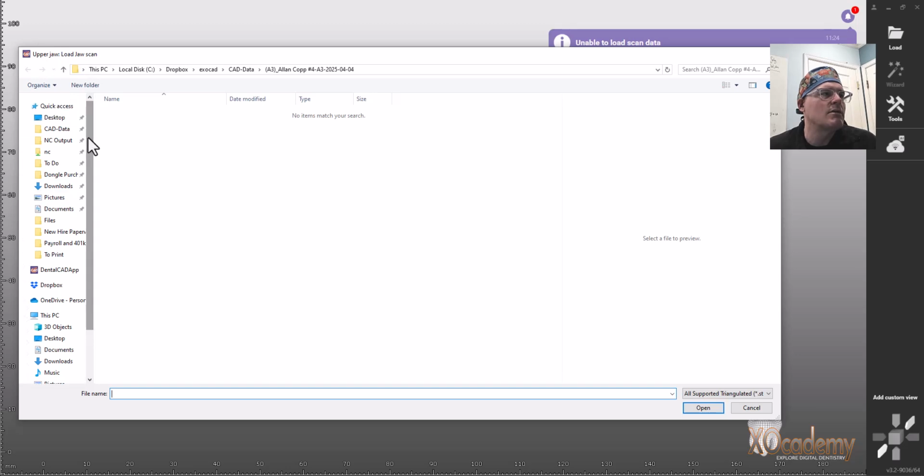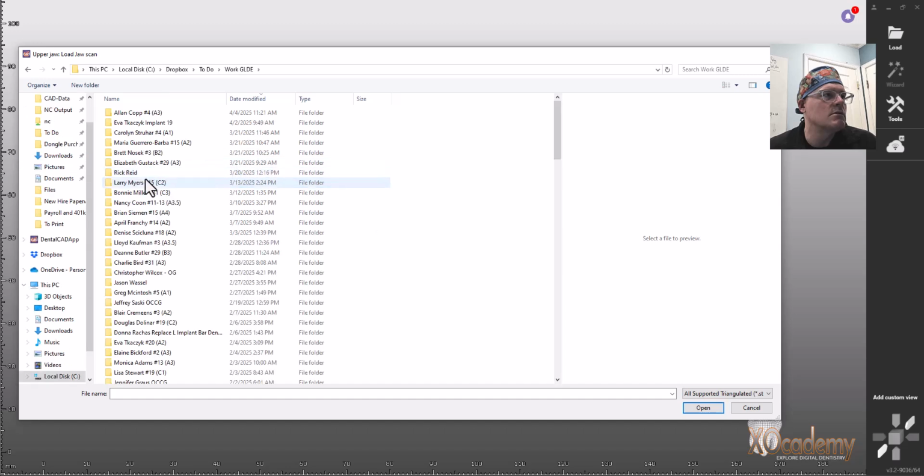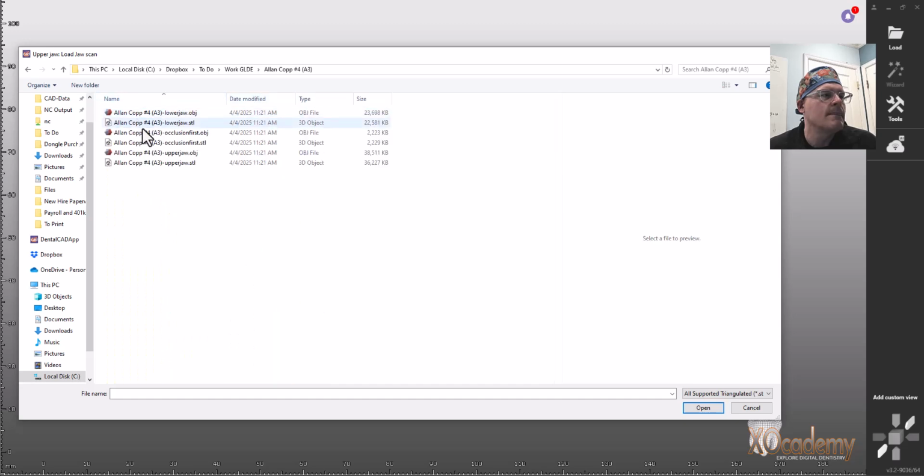So I'm going to go to wherever I downloaded that folder from Medit, which is in my to-do, and it's for the New Baltimore location. It's this top one here. I've sorted by the date modified, and it's this top one here. And now here are all the files.